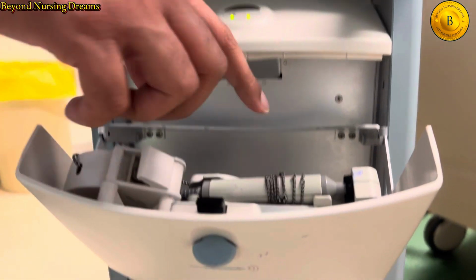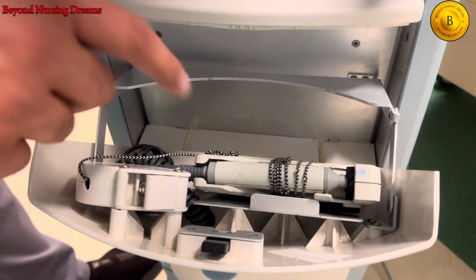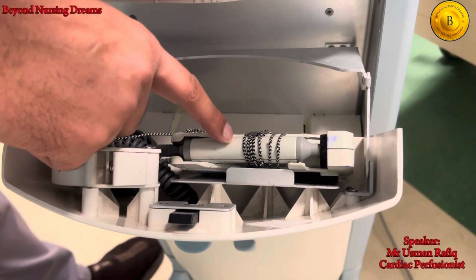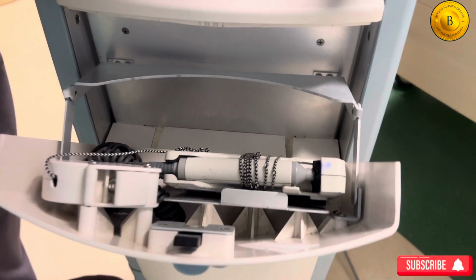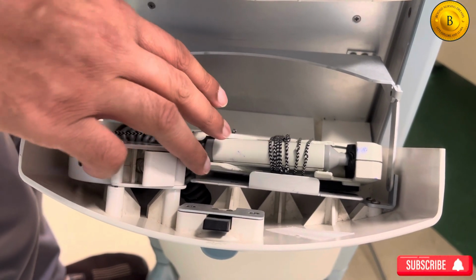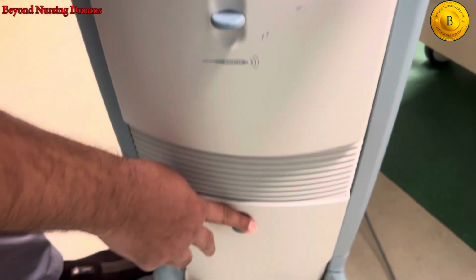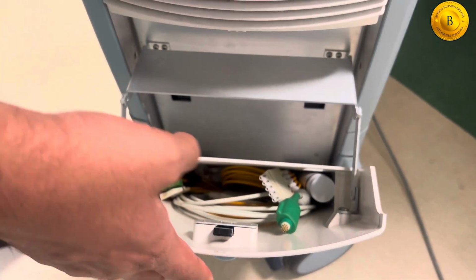It also gives an intra-aortic balloon pump Doppler. So what's the purpose of the Doppler? When we are inserting the intra-aortic balloon pump catheter, we need to check the limb pulses with that Doppler. So this is its basic main role. When we are inserting retrograde through the femoral artery, we use the Doppler to check the pulses of the legs. If I show you down here, we are keeping extra cables here.